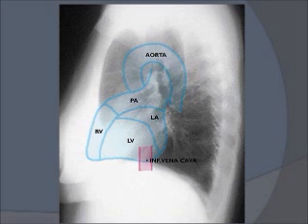But on a lateral view, the anterior-most chamber is formed by the right ventricle. So this has implications in cases of individual chamber enlargement. This knowledge is important actually. So in the lateral view you see the right ventricle is the anterior-most chamber of the heart, and the left atrium is the posterior-most chamber of the heart.